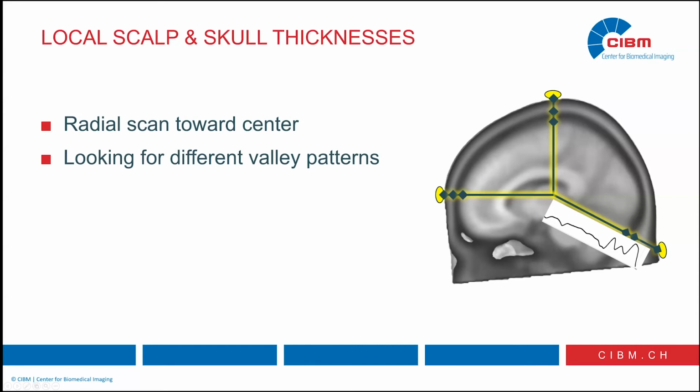That's bright, so that means there is fat or muscles. It's dark, so here it's the skull, and so on. It's kind of difficult to estimate because, again, of noisy MRIs.